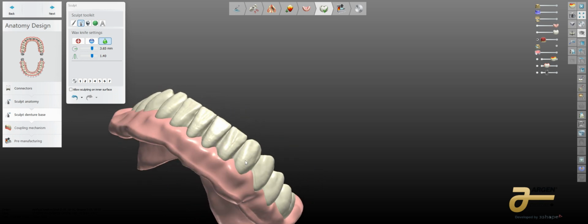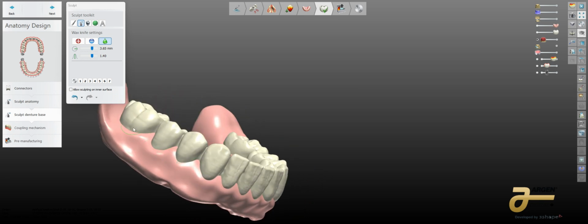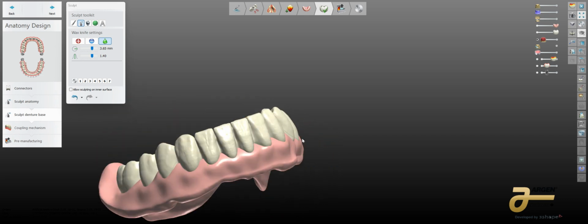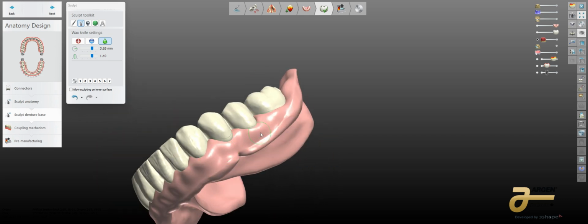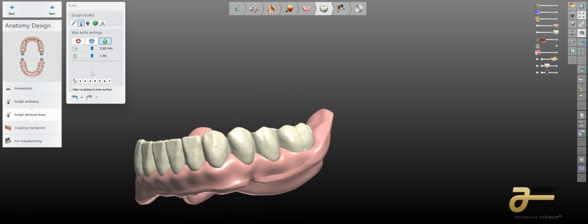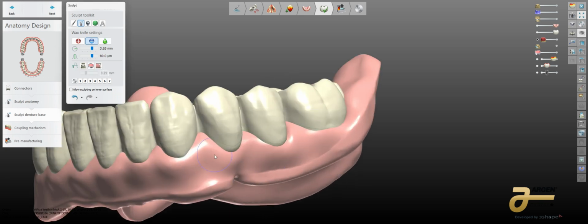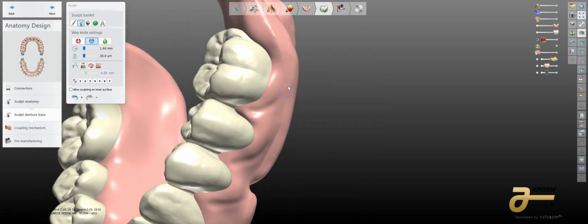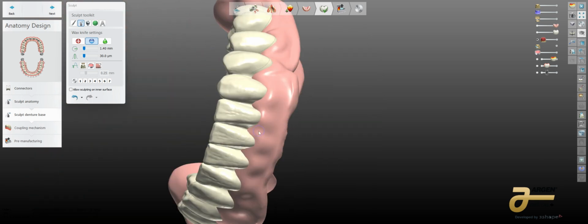So again, it's been my pleasure to show you how I use my workflow for this type of stuff. I don't really need to spend the entire time to bull this up, but I'm going to spend just a couple more minutes to idealize some things just to get a little bit more look to it. Show you what I do for these.